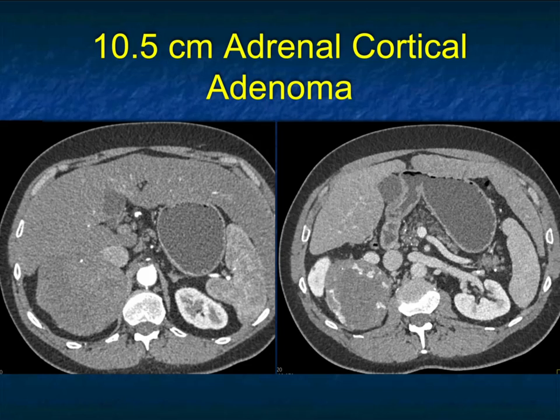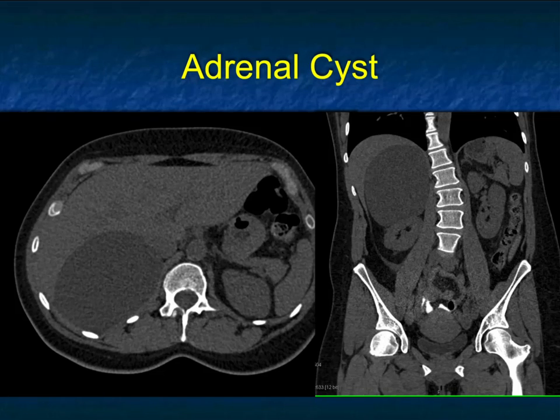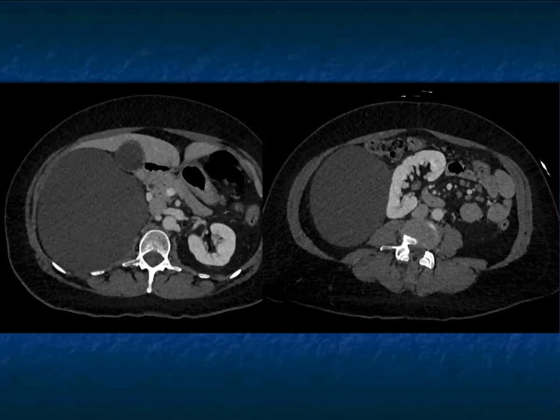So very, very unusual, right? We typically say, oh my goodness, this must be malignant. This was benign. Size is important with adrenal lesions, but again, you can have large masses, whether it's adrenal adenoma or, like in this case, adrenal cyst. And we just published an article with the people in endocrinology talking about large adrenal cysts, that when they get to 10 centimeters, at that point, perhaps they will stop growing and you're able to follow them.